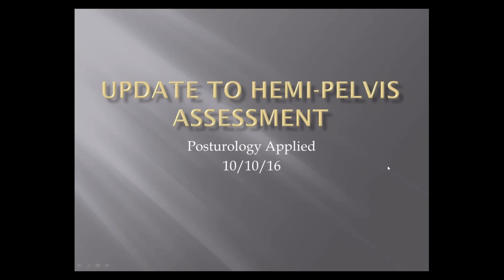I want to give you some tools to do a better job and a more accurate job of assessing for leg length inequality and hemipelvis, because we feel like those are really important things, and you want to be as accurate as you possibly can with this. So we're going to jump right in.